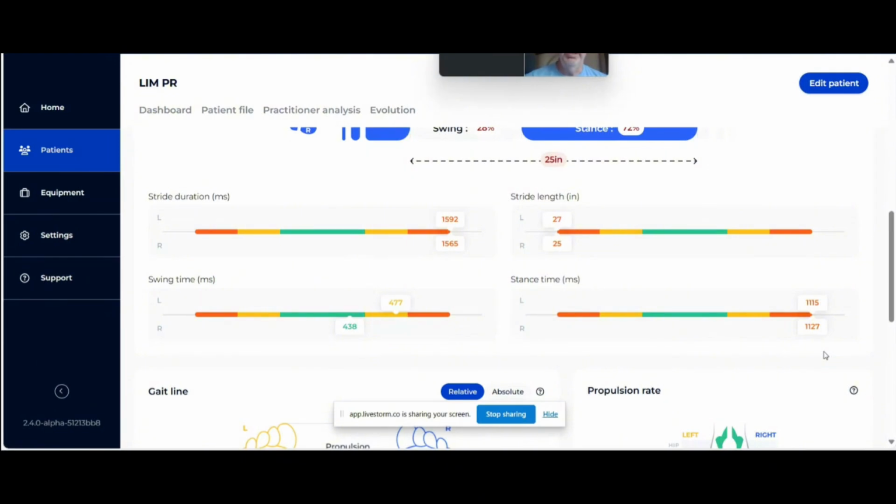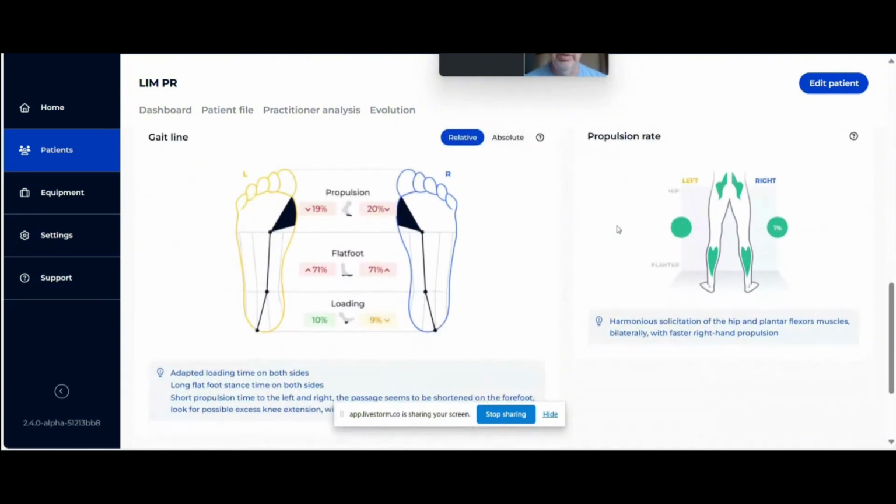The reason we are concerned with that is the implication that it might have to do with wounds. And there are some other factors obviously associated with that, such as the shear forces, as well as changes in temperature in that particular area. And again, we also see that the stride length is again extremely low for that particular person. So this is how you can get a little bit deeper into those spatial temporal parameters.